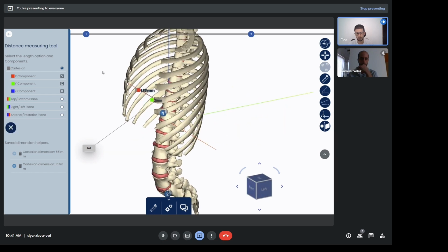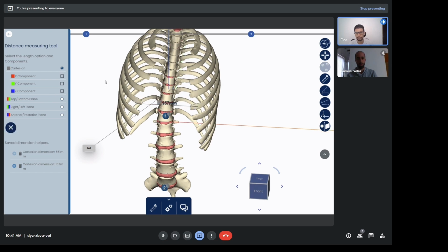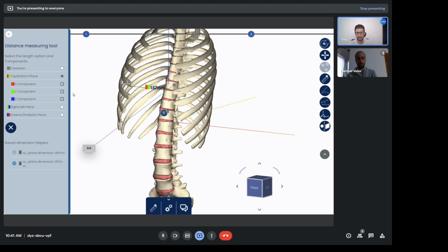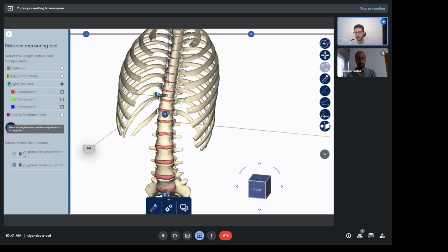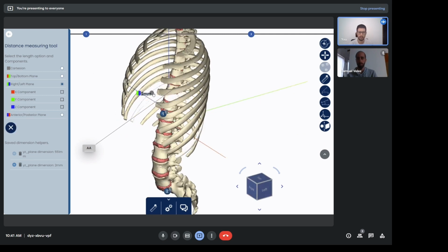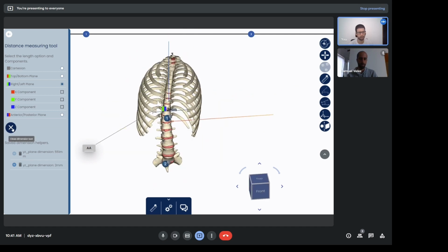You can see here that for the most part that dimension goes along the x component, but there are other components to it that you can enable or disable. Furthermore, you could restrict the dimension to the dimension that is projected onto different planes, denoted here by the two colors, in the case of top bottom, right left, or anterior posterior. So this is one example of how DISRP can be used to create dimensions.